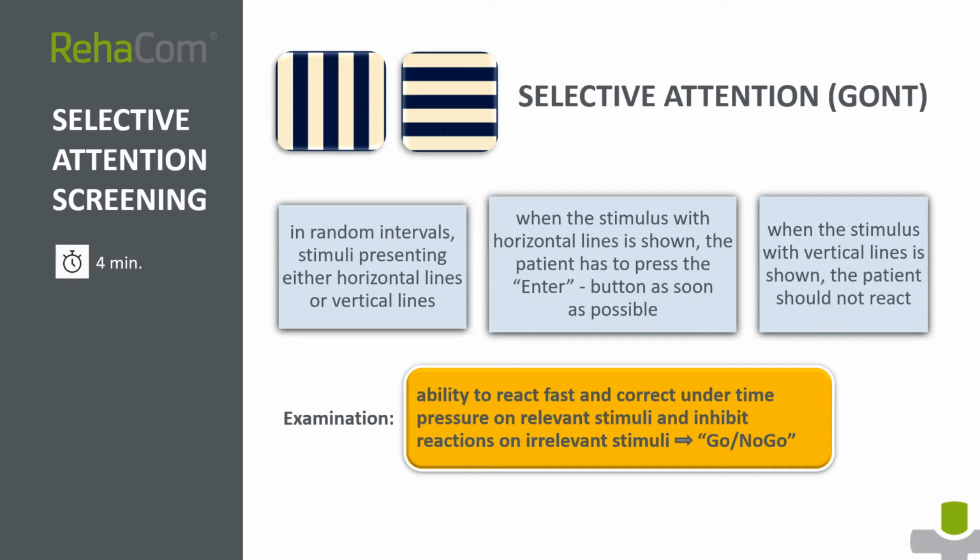Additional information such as omissions, outliers and anticipations is provided. Depending on how slow the working speed is and the degree of impulse control, for example the training module's reaction behavior and/or responsiveness are suggested.